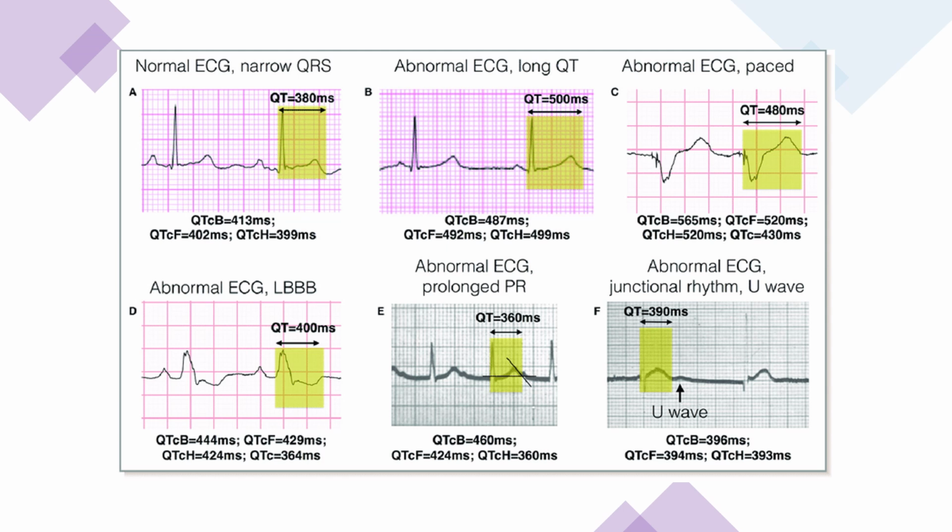So these are a couple of examples of measuring QT intervals. And these are there for your reference.